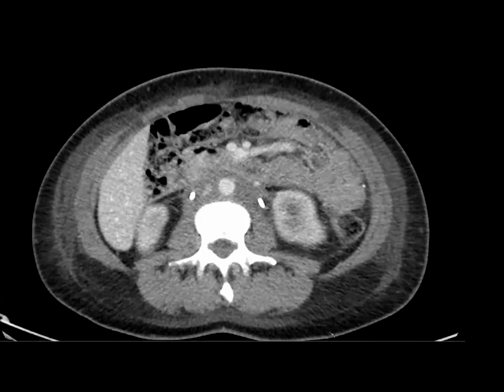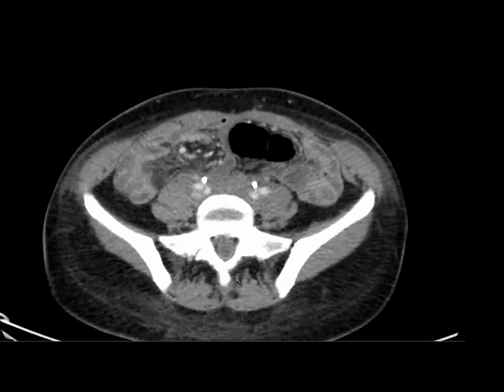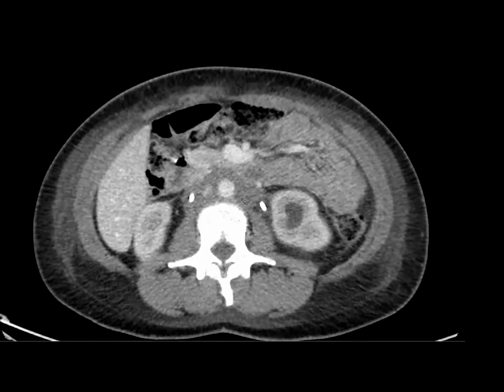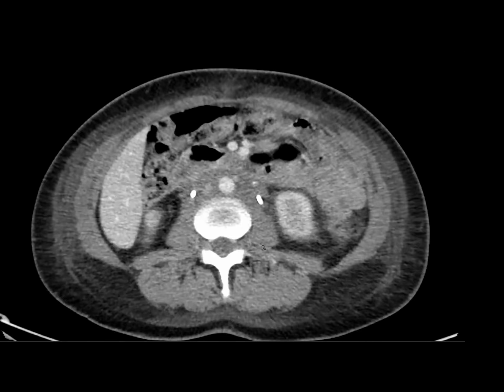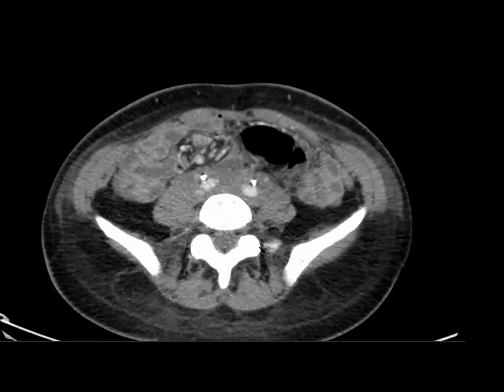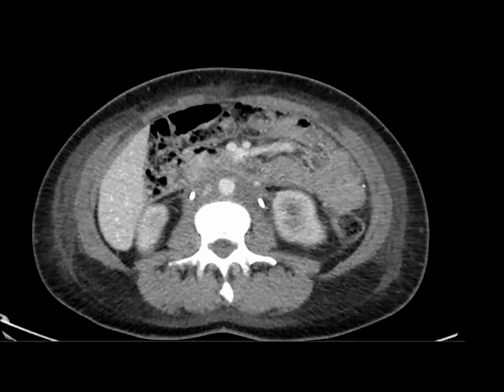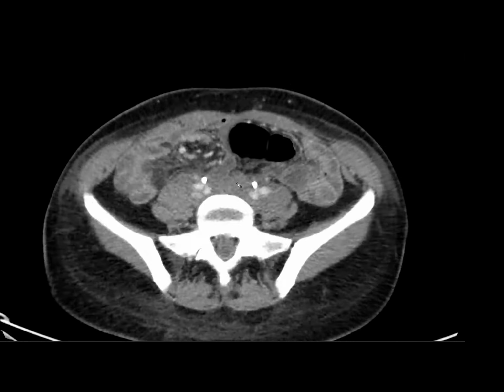If you need to, you can biopsy this. So you can go retroperitoneally. The stents really help you because you can see where the ureter is and you can get a piece of tissue here. It's still kind of hard to make the diagnosis of IgG4 related retroperitoneal fibrosis. But anyway, the interesting part of this story is that they did biopsies of this and it was kind of inconclusive. They ended up doing surgical biopsy, and this turned out to be a desmoid tumor. So in our group, we were discussing, people were saying, oh, I didn't know desmoid tumors could look like retroperitoneal fibrosis. I didn't know if they could be so infiltrative. So I just wanted to show this as an example of that.